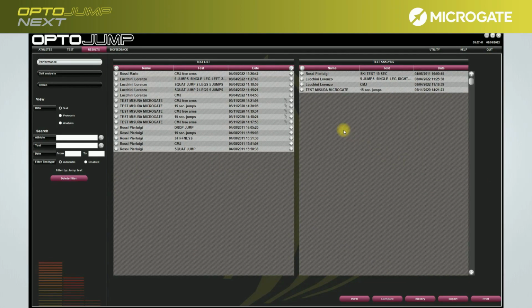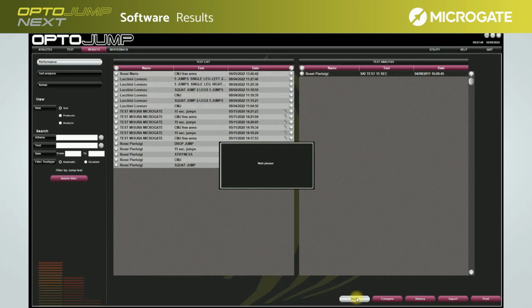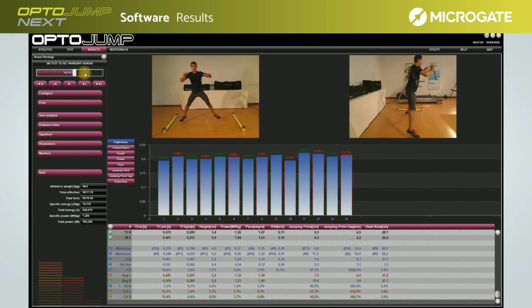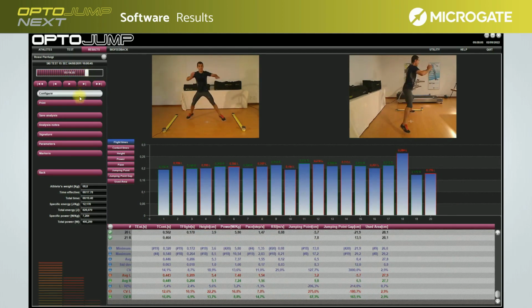But let us look in detail at the features and the different options within the display page of an individual test. The results screen is characterized by 4 levels. The first on the left of the screen features a timeline showing intuitively how the test was conducted over time. Immediately below, a selection menu allows you to configure, print, and save all the analyses performed in the most common formats.